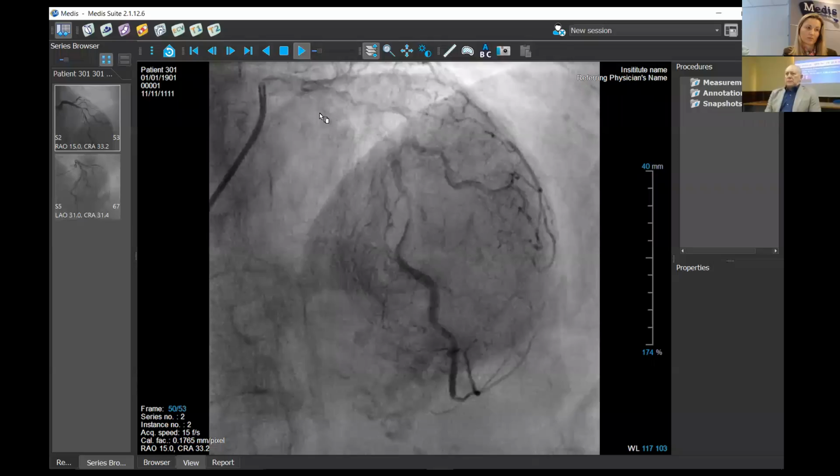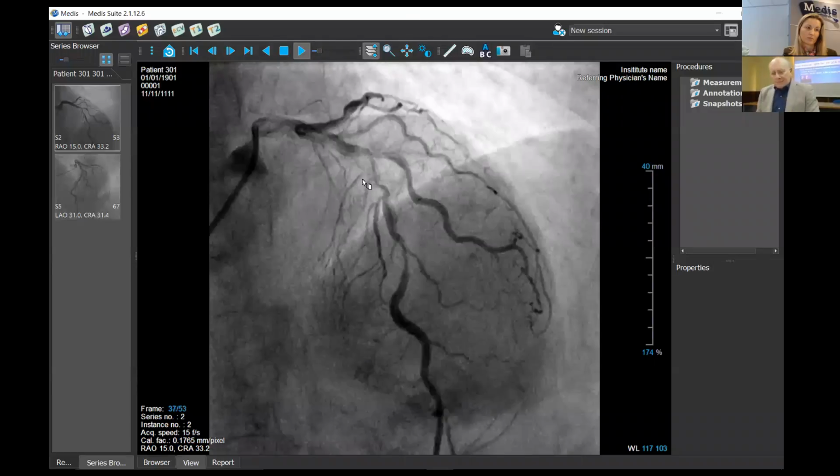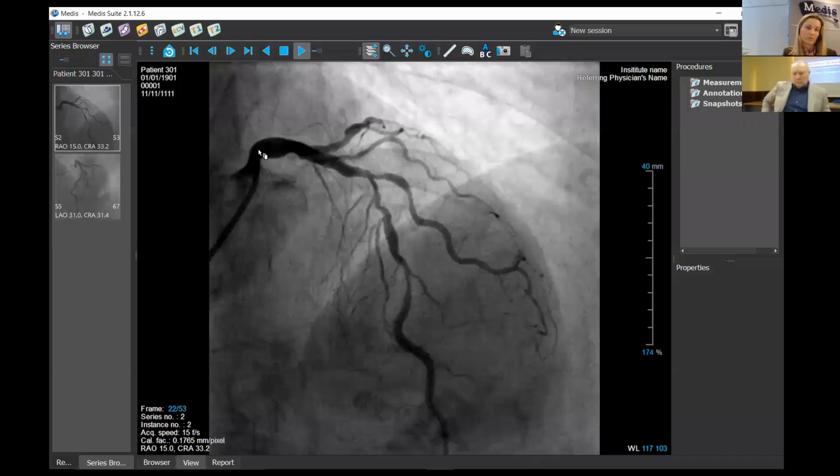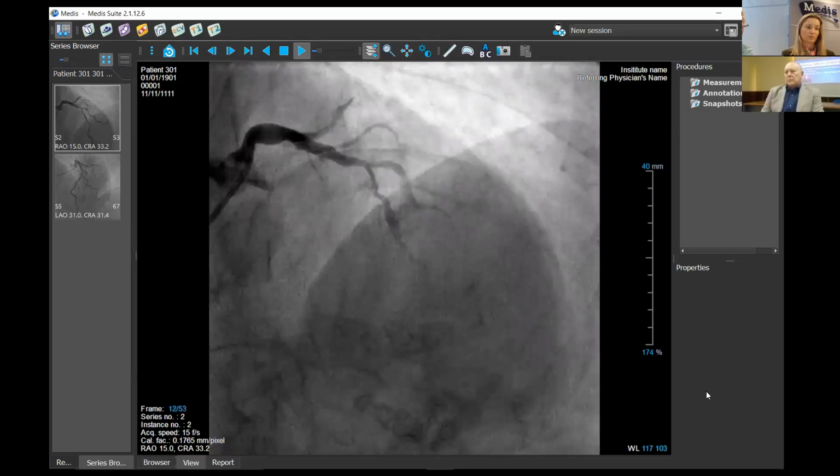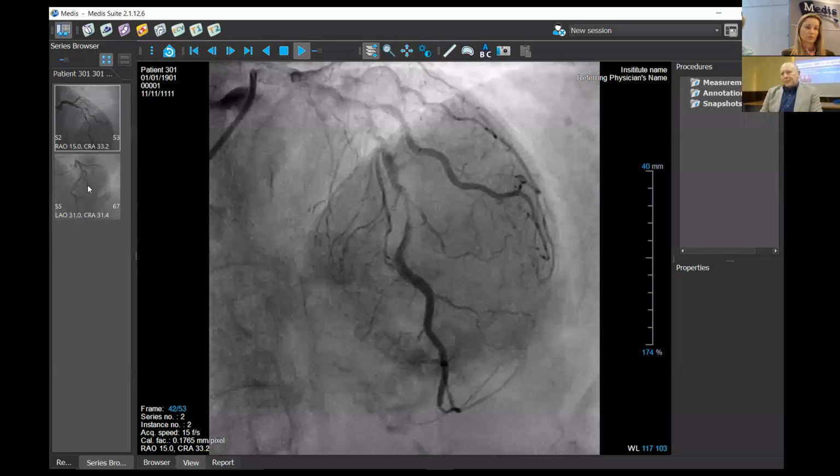Okay, so I'm Gennaro Broia de Lucia, supporting the product for the Italian market. We will see now the workflow and why it's feasible to have an extensive usage of QFR in your lab. So let's start to see what we need to have the QFR done. We need 2 orthogonal angiogram views with 25 degrees of minimum difference, acquired at 15 frames per second.